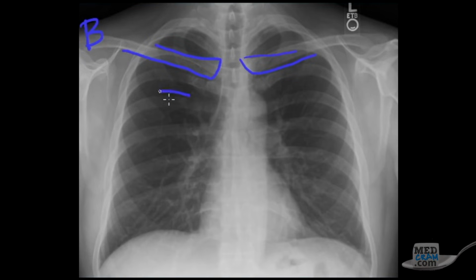The ones that are very horizontal are the posterior aspect of the ribs, and then you'll see ones in the front that are coming down. These are the anterior portions, and you can see if those are fractured or not. This one right up here at the top, you can see here right above the clavicle, is the first rib. You see the second ribs here as well.